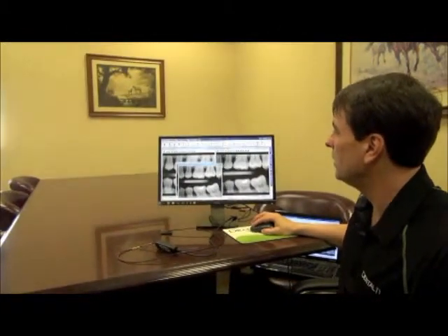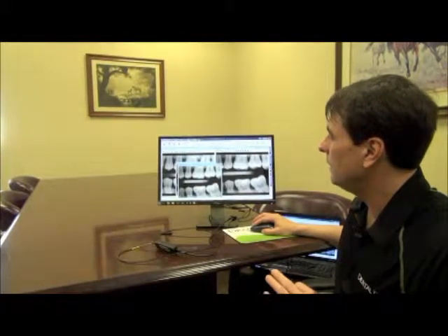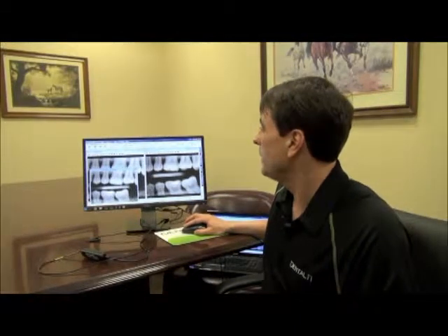Click Cancel there. When you're done printing, you simply close these images, and if you have not clicked File Save on these individual images that we've duplicated, it will get rid of them from the patient's record. But no concerns because we still have them in the original layout, so we're not deleting the original images. So we'll just click Close.